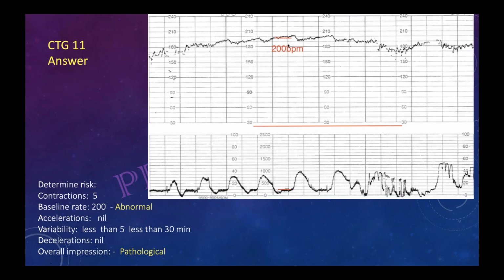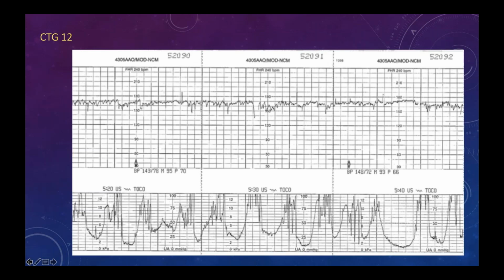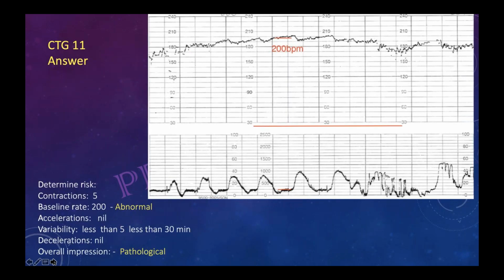Do we take this as tachysystole? Tachysystole, what we read, it has to be how much? It has to be more than 5 contractions. So more than 5 contractions will be tachysystole. Maybe in this patient, we don't know the whole scenario, it is hyperstimulation because it is associated with an abnormal CTG. But we don't know what the scenario was. Five or more contractions with abnormal CTG will be hyperstimulation, right, ma'am? Yeah, that will be hyperstimulation. Only contractions will be tachysystole.